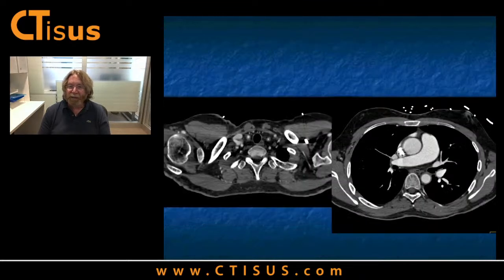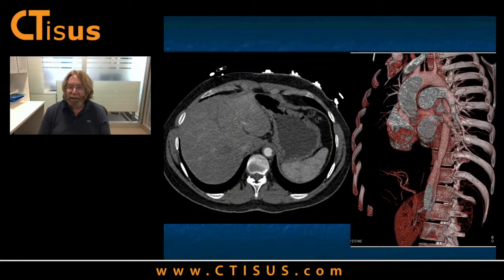What does that mean? There it is on the carotids. There it is on the descending aorta. What are we thinking of here? Here it is on the thoracic aorta, and here is a 3D showing you the patient's left carotid, really narrowed, and left subclavian, really narrowed. So what am I thinking about?